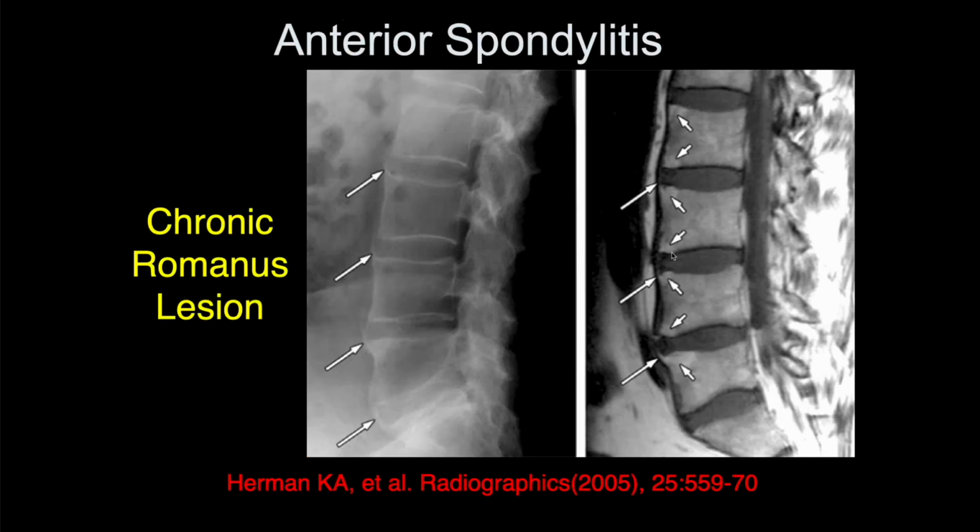But the inflammatory changes we can see by MR, and you don't see them very well by X-ray until they're really later, which we can see as these sclerotic areas. And notice that the edges of the disc are not rounded like they normally are. They're very angulated, which is typical. So this is late disease. At this stage, this patient has fusion of a lot of these discs, most likely very poor motion, and this is irreversible disease. So we've really waited way too long in this individual.